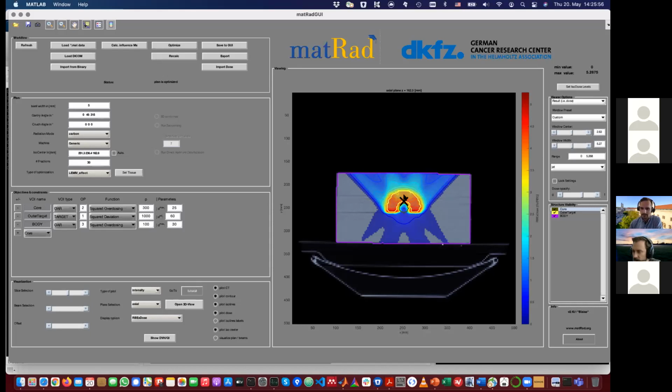And yeah, so this would mean I highly overdose the tumor, and also I overdose the healthy tissue here, because the entrance dose, let's say for the beam angle coming from 0, if I look at this turquoise color, already corresponds to 2 gray. So this is now the RBE weighted dose for a treatment plan that was purely optimized on the physical dose.